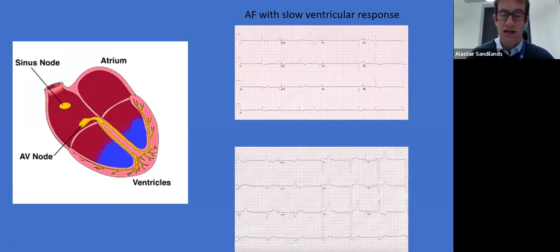In comparison now, when a patient in atrial fibrillation, the AV node does not work, so none of the AF now conducts down to the AV node, we now will get a complete heart block. We will now see an escape rhythm. So now in this ECG, we can see that there's a bradycardia, 1, 2, 3, 4, 5, 6, probably 7 there. So again, 42 beats a minute. It's a bradycardia. What is the QRS? The QRS is broad. It's a regular rhythm now because the spacing between every QRS is the same.